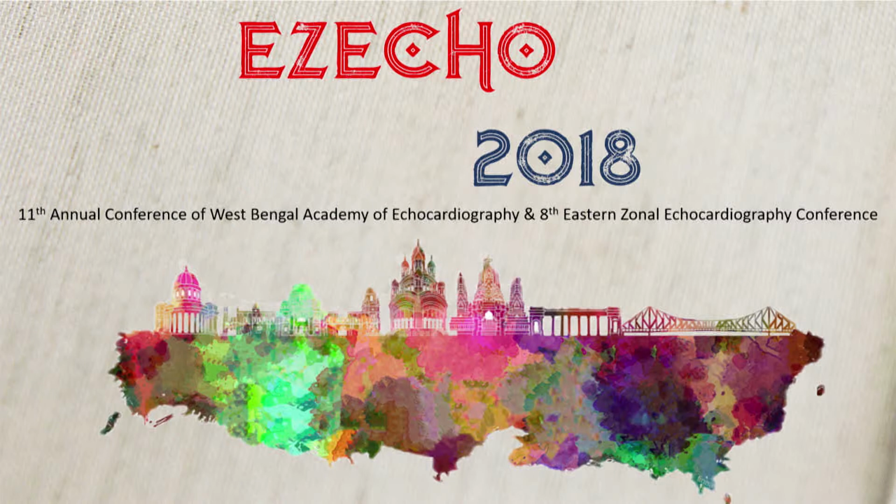Did you have a chance to do a 3D of the tricuspid valve to see if the pacemaker lead is impinging on the septal leaflet? Well, sir, there is a provision, but we didn't do it. That might be one of the possibilities. Low pressure TR, right? There's a history of a pacemaker before. So if it's impinging on one of the leaflets, that can probably cause significant TR. Could it be because of this electrode-induced damage to the tricuspid valve? Right. Okay, I mean, it's worth excluding.